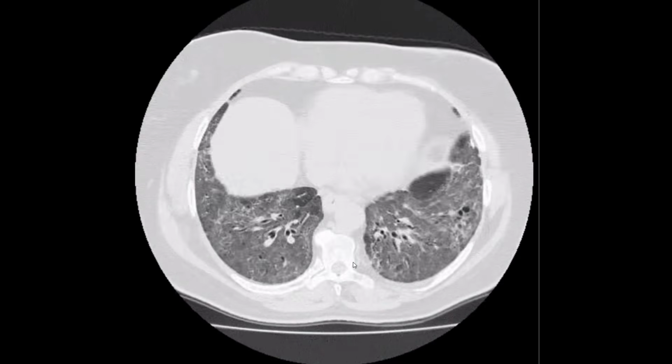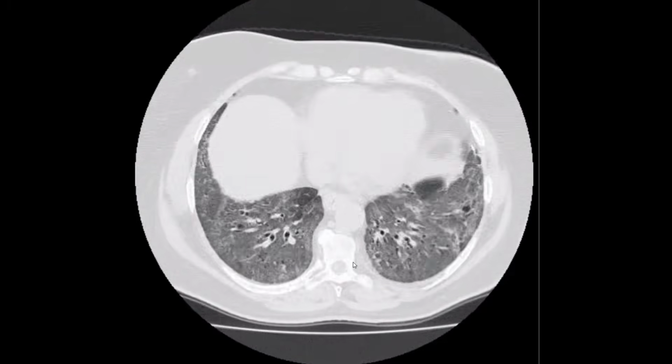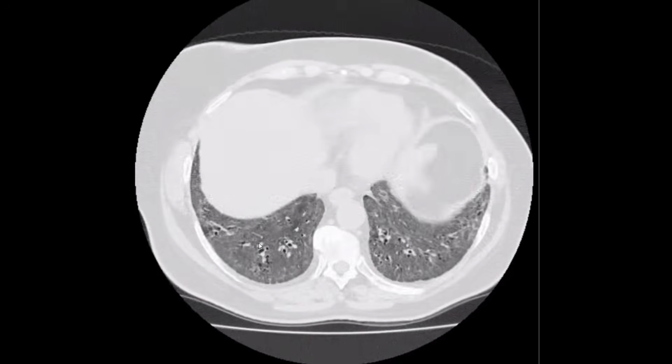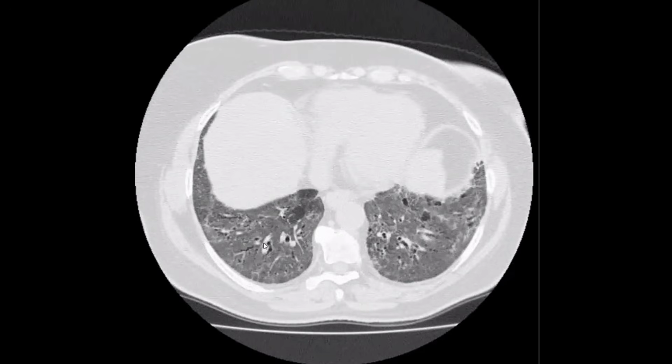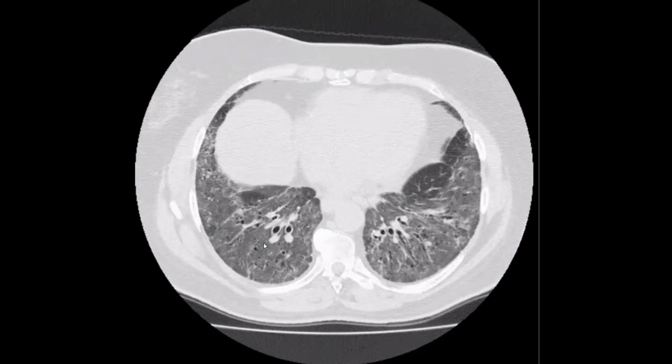But it's a very good option, really. This could be cryptogenic interstitial pneumonitis. Okay, we also don't have some cystic changes typical for UIP. If I tell you, is it UIP or NSIP, what do you think? It could be NSIP, yes, but not UIP.